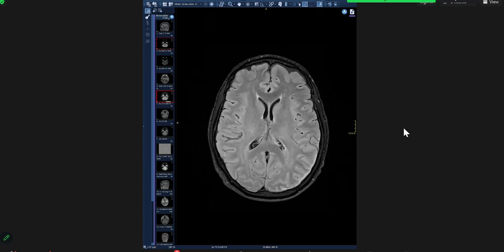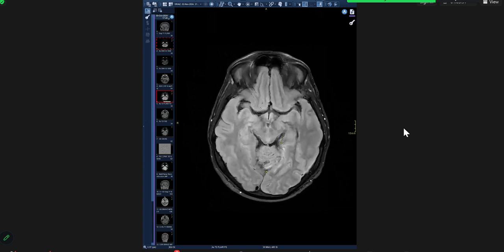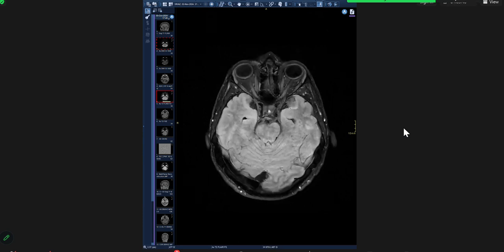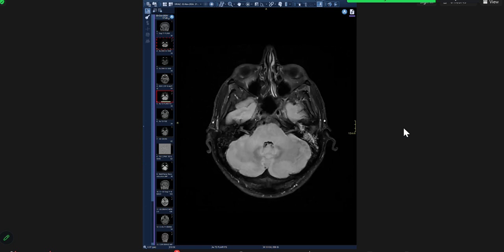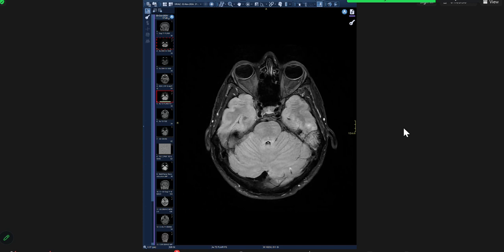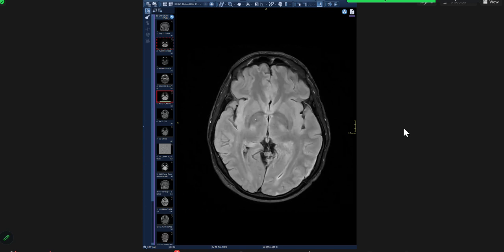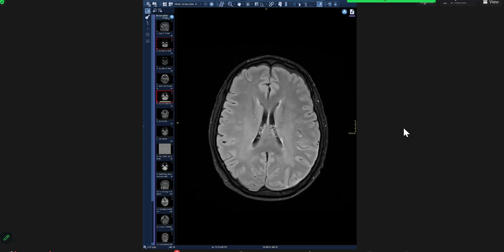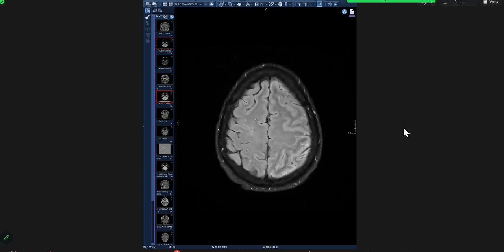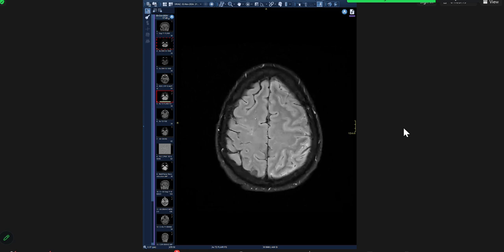So it's your first case. This is an MR axial FLAIR image of brain, in which I can see fluid in mastoid air cells and multiple hyperintense foci are noted in bilateral centrum semiovale. You can ignore those.